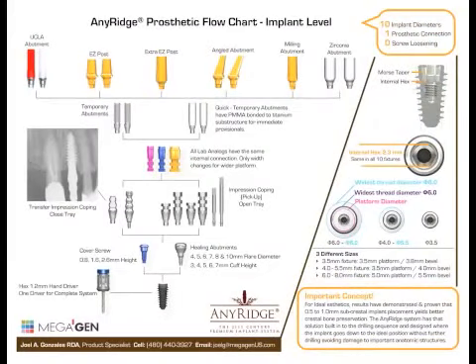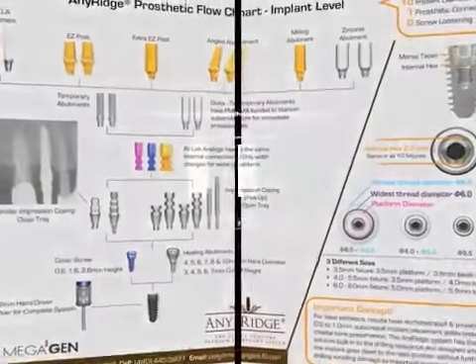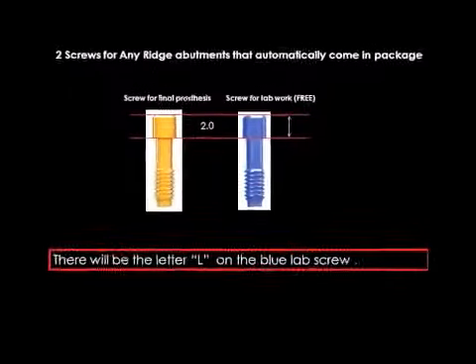Here you see all the different abutment options that are available: easy post, extra easy post, angled abutment, milling abutment, zirconia abutments, one prosthetic table. We do have your PMMA temporary abutments that are very nicely utilizable for immediate prosthetics.